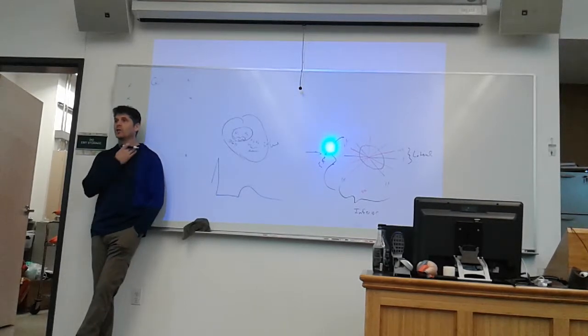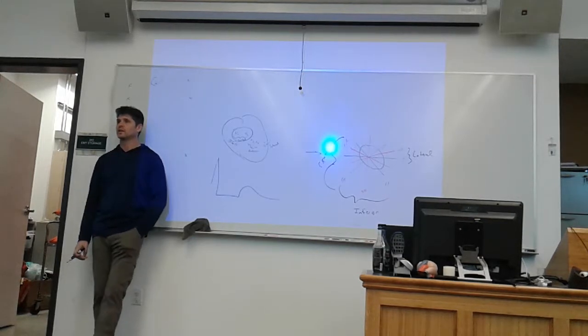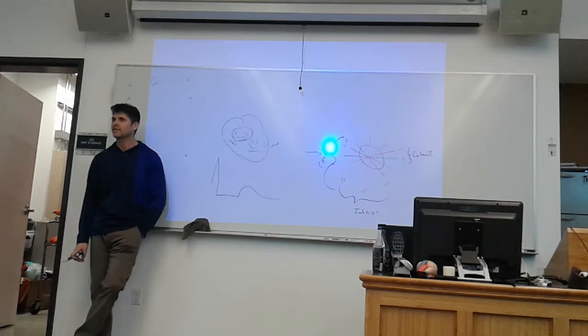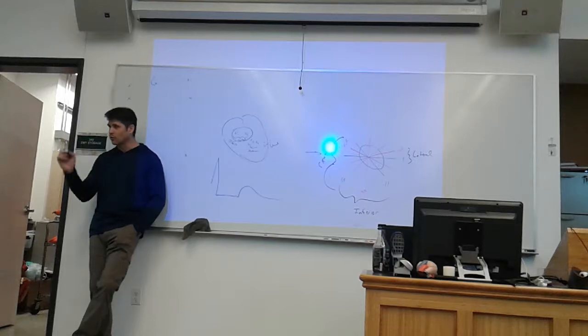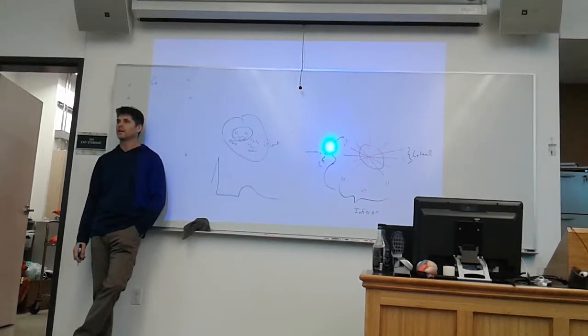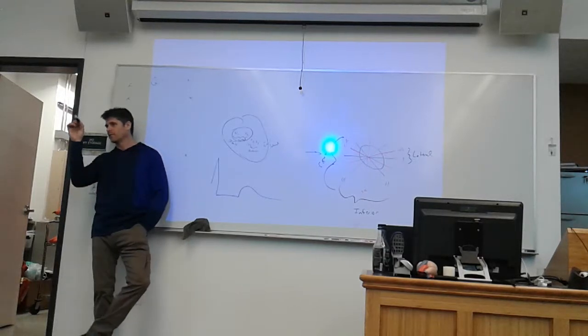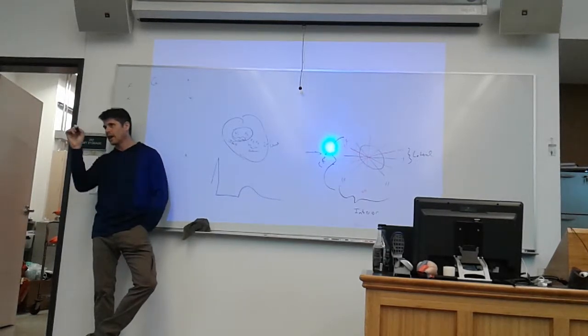And you'll have to make a note on the EKG, because the EKG would not interpret it. The EKG just interprets it as if they're in the right place. So you'd have to physically write on the EKG that this is a posterior 12 lead or a 15 lead, and where it says V4, V5, and V6, you change it to 7, 8, 9.